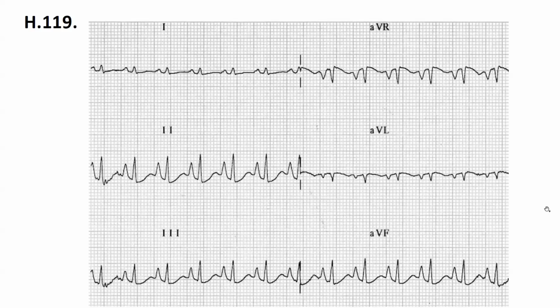It's rhythmic, and I see a P wave. The shape of the P wave in the second lead is not normal.